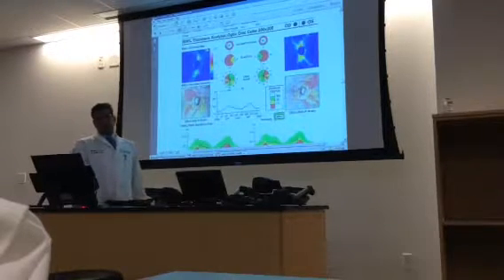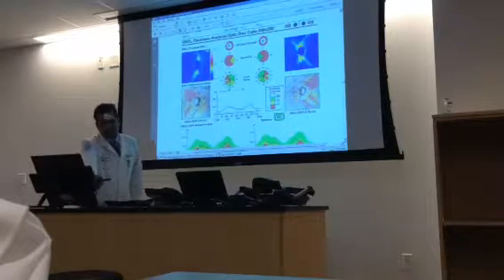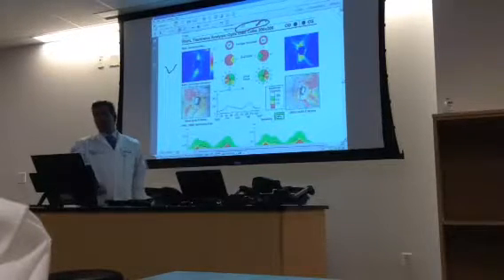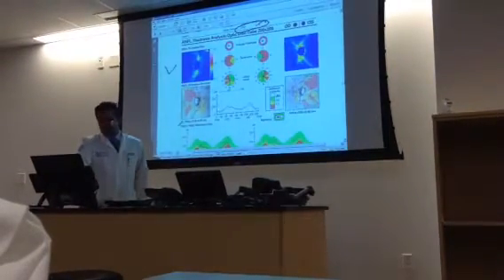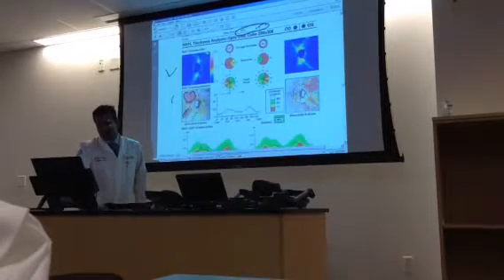Look at the signal strength, 6 out of 10. Is that acceptable? Six out of 10 signal, is that good? Signal strength? Sure, acceptable. You look at the deviation map, right here, and you see big chunks of problem.